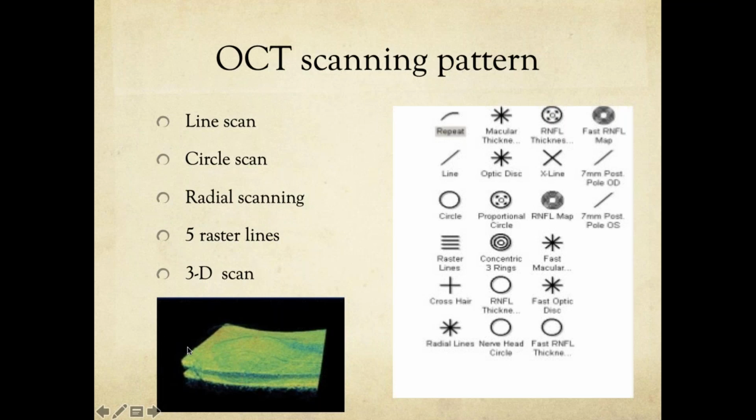What difference would it make scanning the whole retina at just like 5 microns? Because in a CSCR, the pathology is completely the same overall throughout. So what you do is you just do a simple 5 raster and take sections. In those rasters, if you see certain pathologies which you think could have been missed, or you become suspicious of it, then you switch to a 3D scan. 3D scans usually take a longer time. 5 rasters is a shorter time.